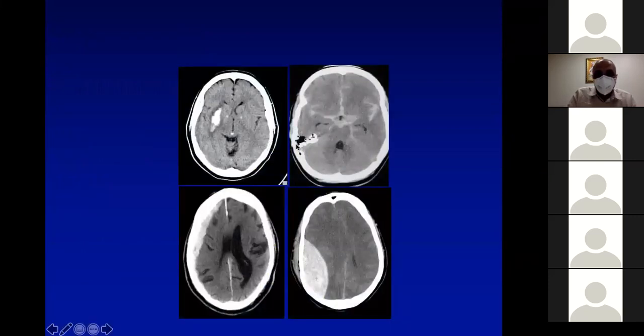Now, looking at this hemorrhage, this is a hyperdense area which is in the region of the right lentiform nucleus. This is an acute bleed, and again, as I've mentioned before, it appears hyperdense. This is an intraaxial, intracranial hemorrhage.